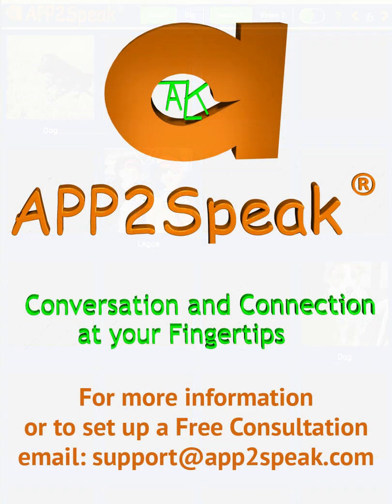APP2Speak is compatible with the accessibility features within the tablet, such as the external Bluetooth switches, touch accommodations, and low vision. For more information or to schedule a free consultation, please send an email to support@app2speak.com.